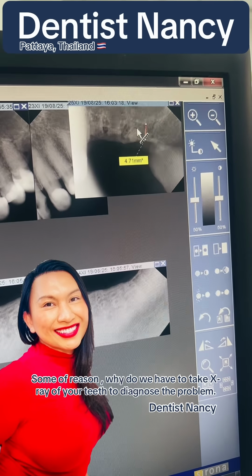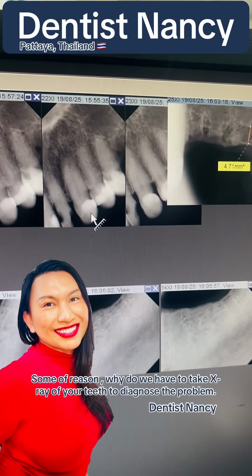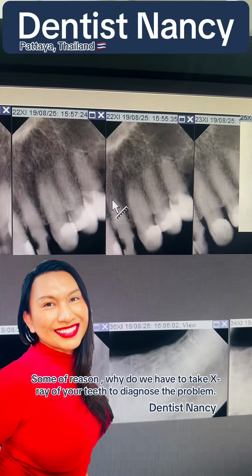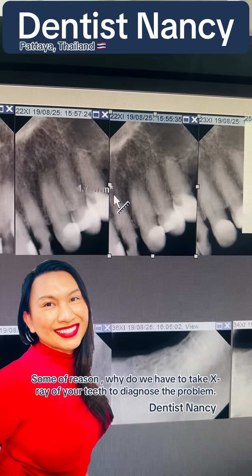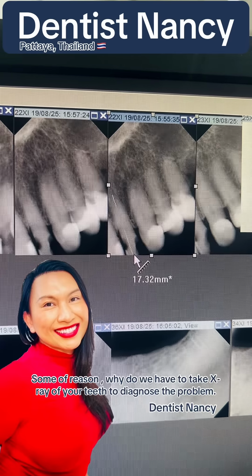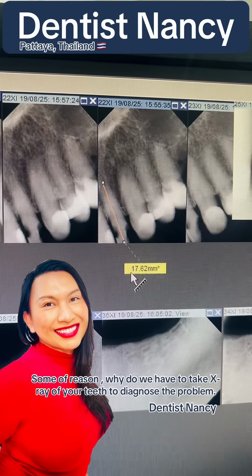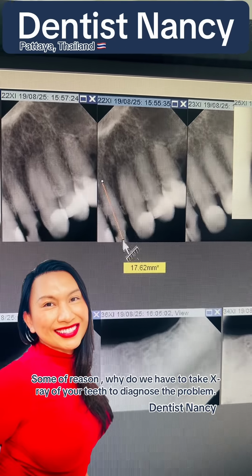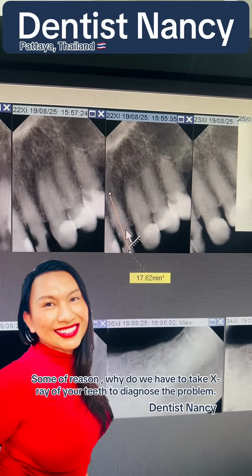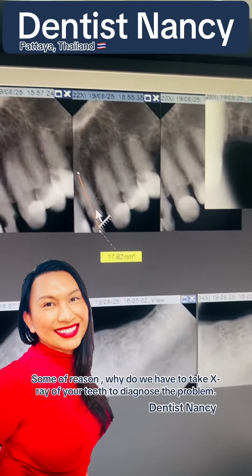And we can also measure the length of the tooth roots. For example, if we need to do root canal treatment for this tooth, we want to know how long the tooth root is. We can also measure it just like this. So this is the length of the root canal that we have to put the instrument in. Yeah, we call it the root length.